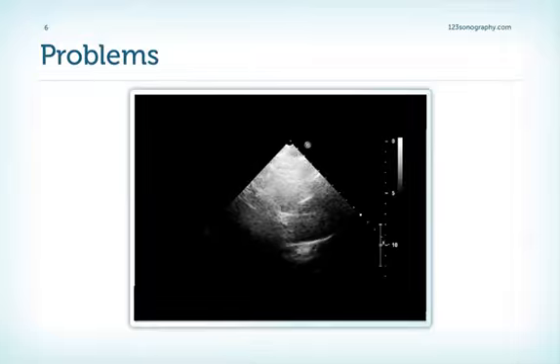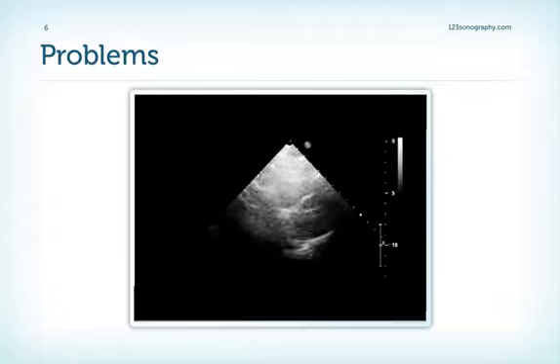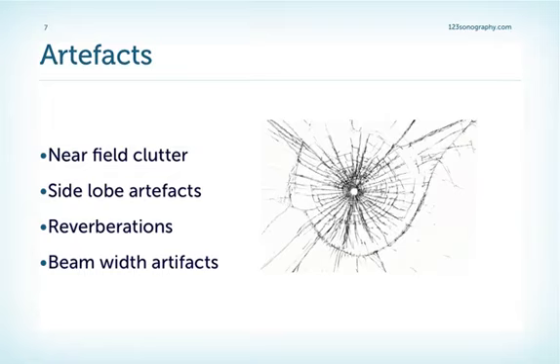And we also performed CT, and there was also no dissection. What we saw was an artifact. As a matter of fact, an artifact which is not so infrequent. This is a reverberation of the aortic wall, a form of artifact that I will be discussing in this chapter. But now let's look at it from a systematic perspective.